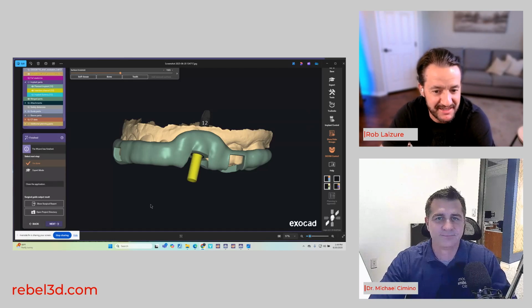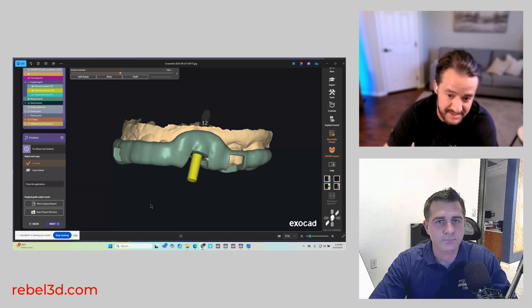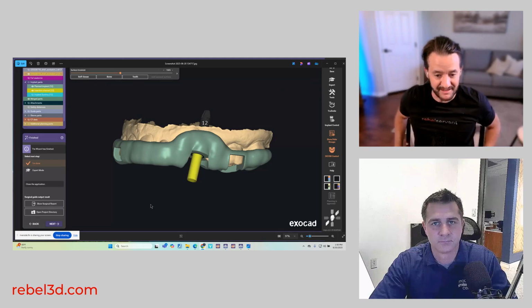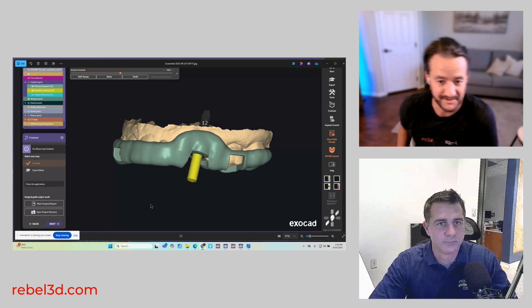Thanks for joining us. We're going to talk surgical guides with Exoplan today. So I'd just love to hear, you're just beginning your journey with Exoplan. I'd love to hear about the learning curve and how you plan to use it with prosthetically driven implant planning. So yeah, just talk to us. What do we got here, and where are you at in your journey? And then let's maybe design a case together.